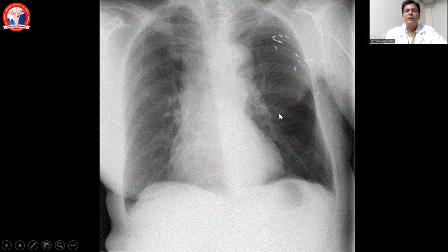The patient had gone through mastectomy earlier, and these are the pins, like surgical staples. So it's one added evidence for that. And this transradiancy is due to the removal of the left breast. We'll go through the next slide.